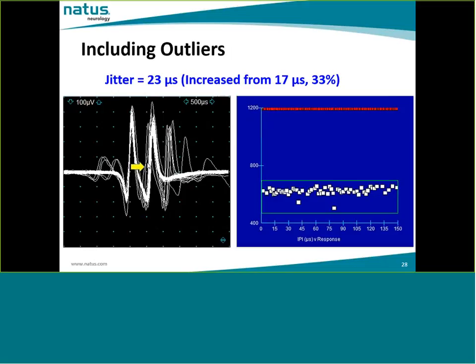Now let's say, for the sake of argument, that I wanted to include those traces, and that is done quite easily by dragging the edge of this box and moving it up and down. This is a static image, so I cannot show that. I will show that later in a video.